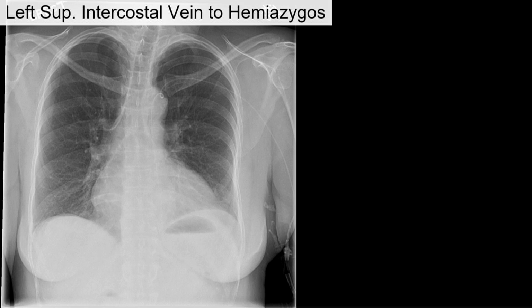This is a patient with a left-sided PICC, and at first glance, it looks like it's coming down the descending thoracic aorta. A couple points here, though: it is projecting below the scalene tubercle, so it probably is venous, and it's also taking this little dipsy doodle here along the aortic arch and then coming back here.